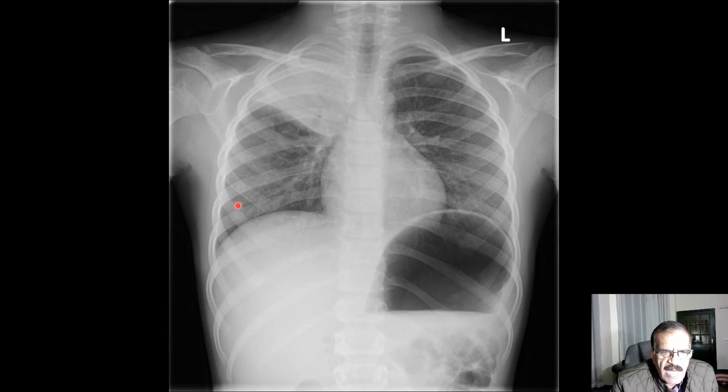And the rest of the lungs are okay. You can see costophrenic angle, cardiophrenic angle. On the left side, the entire left side is normal. There's a big gastric bubble for some reason, but this of course is not related to this pneumonia, although I just remember that in some cases of pneumonia there may be acute dilatation of stomach. Maybe this patient has got that complication. So this is another case of right upper lobe pneumonia or consolidation.